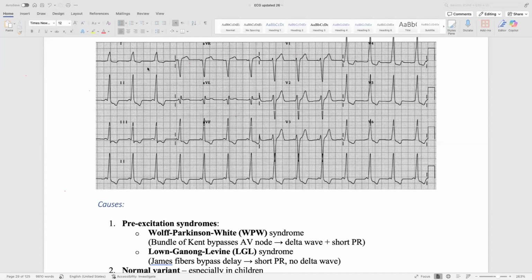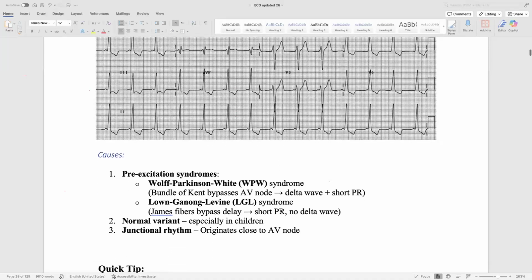Broad complex with abnormal R wave in V1, right bundle branch block. If it is normal, that is good, but there is broad, which is not good. So a bad R wave in other leads, in the presence of a normal lead in V1, that is very bad. This is a normal you don't like.